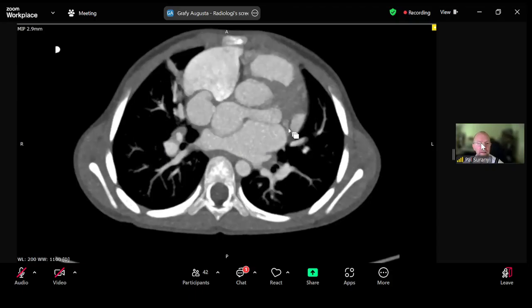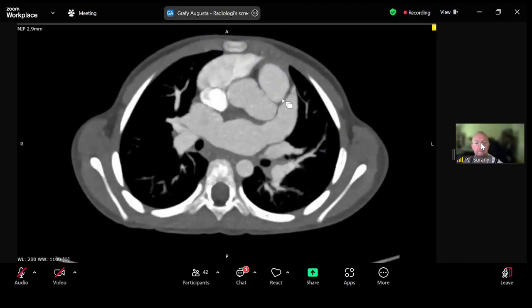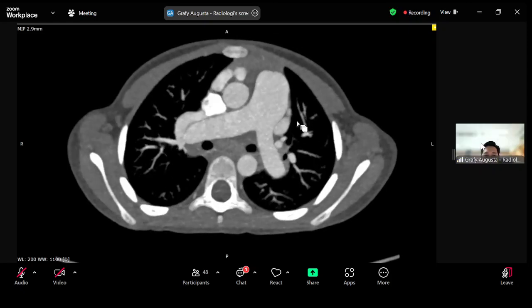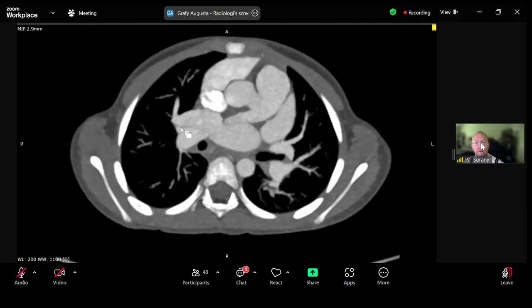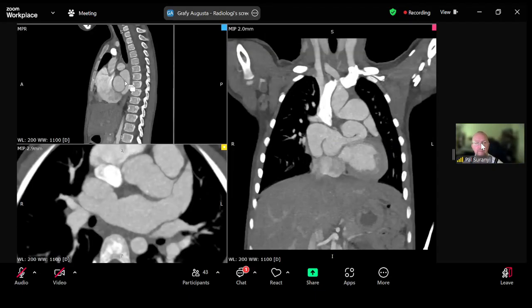And yes, the pulmonary vein compression is not very severe. Would you agree with that? The pulmonary veins are not that stenotic. There is some mass effect, and sometimes I find it easier to look at the effect on the pulmonary veins if you turn sagittal. If you could show that on the sagittal view.